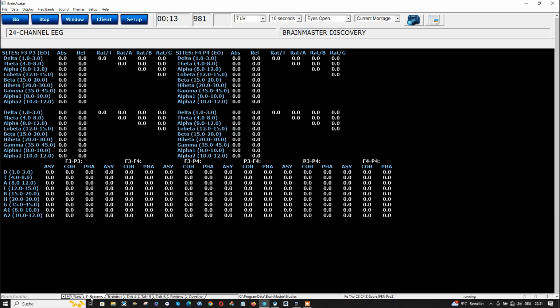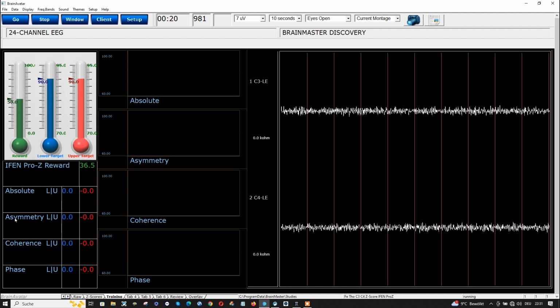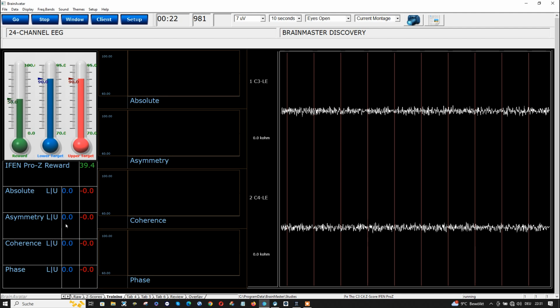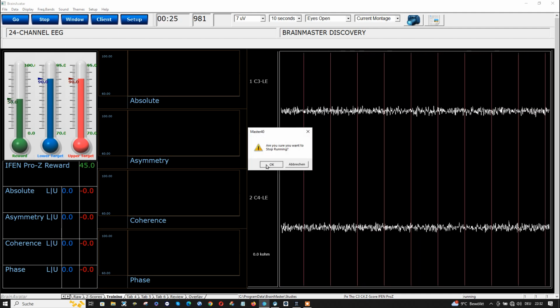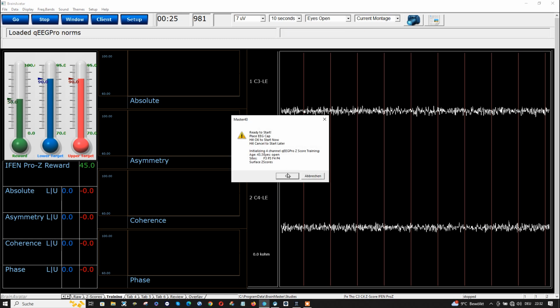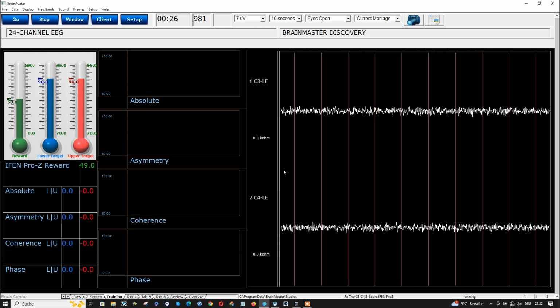we don't see it yet. We have to probably also make changes. Yeah, you see that there is no z-scores computed. We just run again. When there are no z-scores, when everything's 0, you just restart it. And look what happens after this.